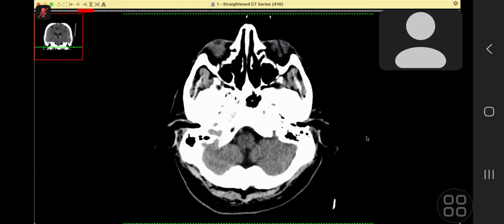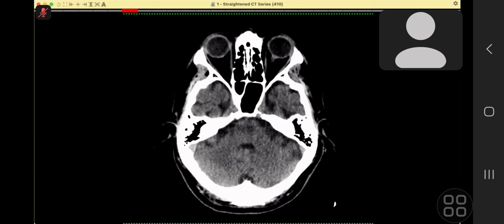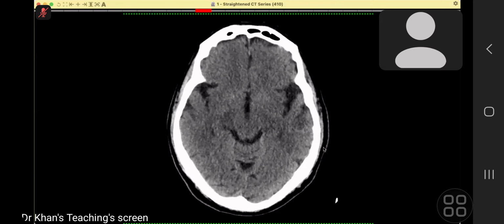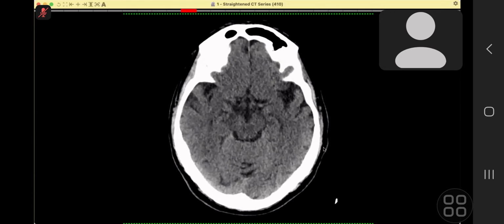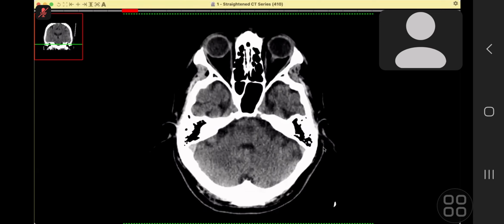First observation, I noticed that there is a hyperdense signal involving the basilar artery. The basilar artery appears normal in size. I cannot see any other hyperdense signals such as a dense MCA sign. I cannot see any obvious space occupying mass lesion in this non-enhancing brain CT scan.